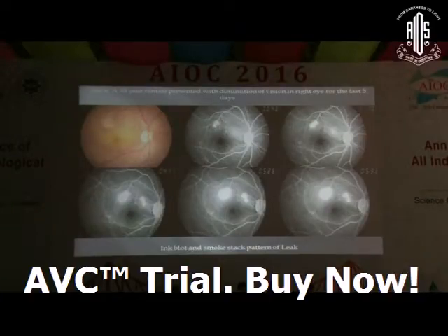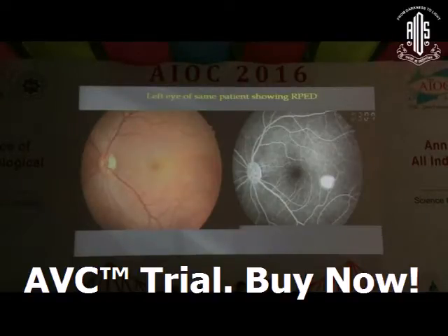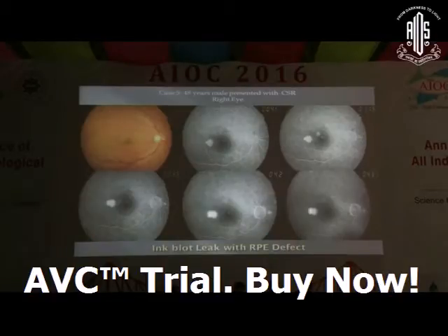Case 4, a 33-year-old female presented with diminution of vision in the right eye for the last 5 days. FFA was done. In the initial film, there were 2 leak points. One point got converted into an ink blot, the dye spread in all directions. The other one went into a smokestack pattern. So it is a combination of 2 leaks of different patterns. This is the left eye of the patient. It shows a small PED.